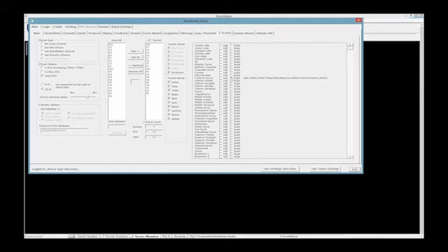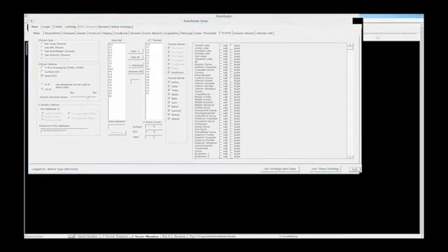Now, another thing you might be getting into is looking at this and going, you know what, I really want to do all regions of interest. I want to do all 10 bands. I just want to try and train everything to normal. This is going to be a little burdensome if I'm going to go through here and click every single thing on and on.